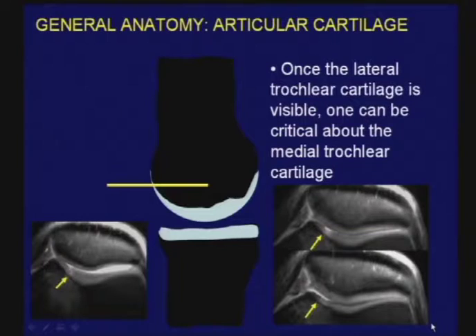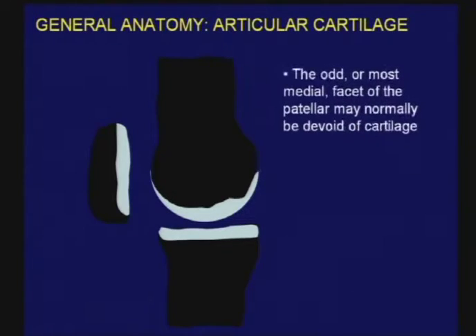So what we rely upon heavily in our assessment of trochlear cartilage is the common presence of subjacent cystic changes in the bone. If I see cystic changes beneath the trochlear surface, even if I don't see the cartilage, I tend to suggest that that trochlear cartilage is abnormal.